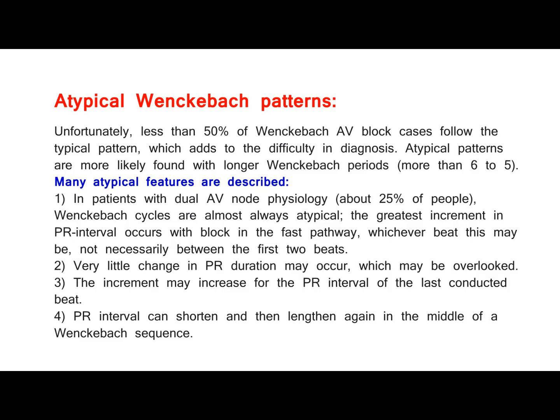1. In patients with dual AV node physiology, about 25% of people, Wenckebach cycles are almost always atypical. The greatest increment in PR interval occurs with block in the fast pathway, whichever beat this may be, not necessarily between the first two beats.